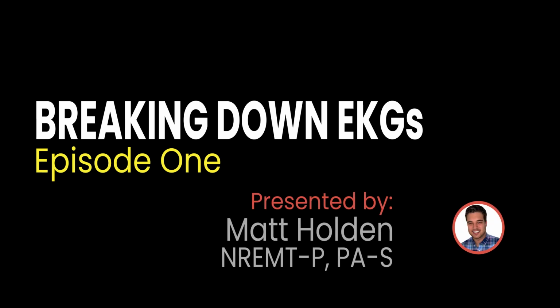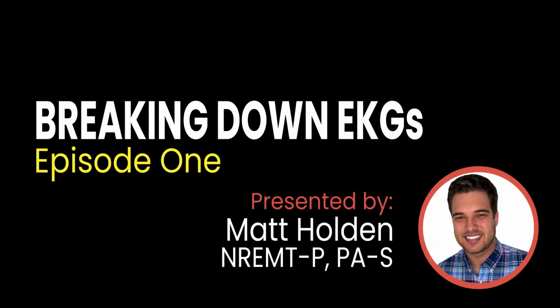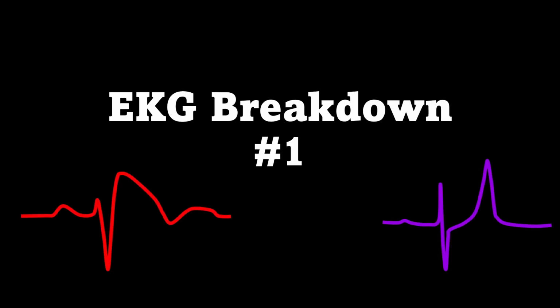Today we're going to be doing another series where we're going to be breaking down various EKGs, which will hopefully help people practice who have some difficulty with them. I understand that the squiggles can be quite confusing. We'll walk through the EKG interpretation step by step, focusing on identifying the rhythm and understanding the 12 lead.